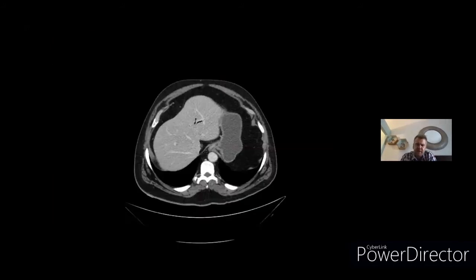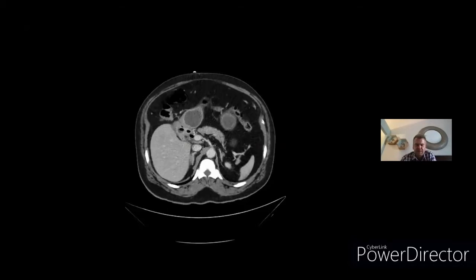The first thing at the beginning you would have hopefully noticed is the pneumobilia, and we can appreciate here the intrahepatic biliary ducts have some air locules in them. Going a bit further down, we can see there's also air in the extrahepatic biliary tree, and you're starting to see it at the dilated duodenum there, immediately adjacent to the liver and bile ducts.